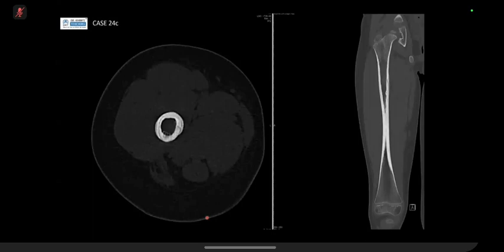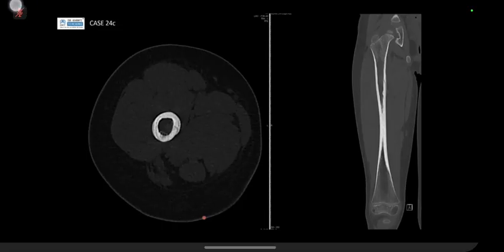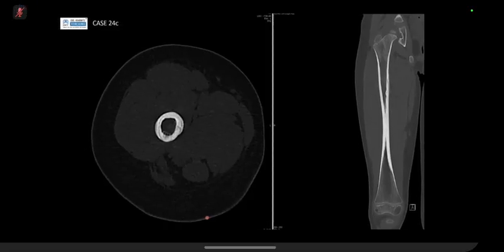Think about one of your differentials you mentioned earlier. And remember, it probably took some delay because clinicians didn't want an urgent CT scan. They said, oh, do it when the next available. So you've got some time in between the MR and the CT, maybe a week or two. Two week wait. So there is a tract communicating from to the superficial. So this could be osteomyelitis.